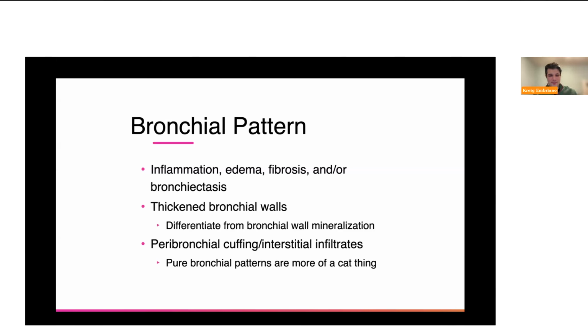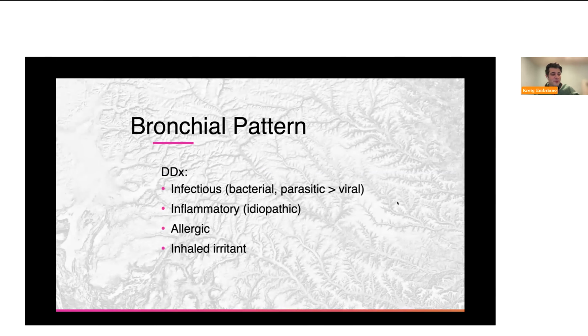Cats are a little easier. They typically have a more pure bronchial pattern without all those interstitial changes. So they're a little bit easier in that regard from a diagnostic standpoint. In terms of our differential list, they're pretty easy and much more confined, I would say.